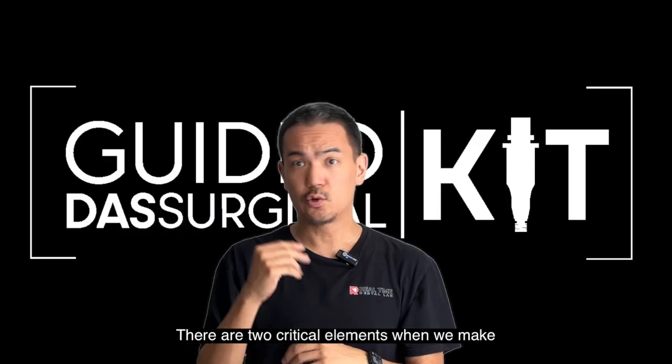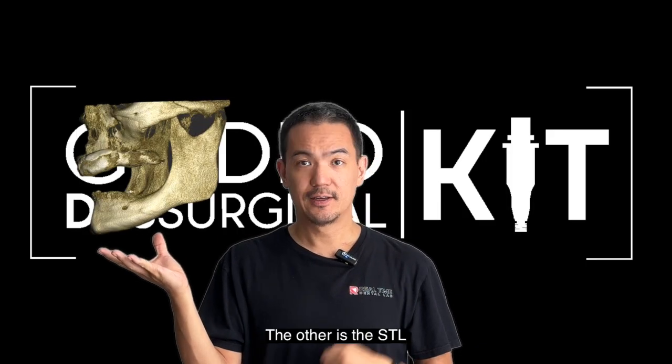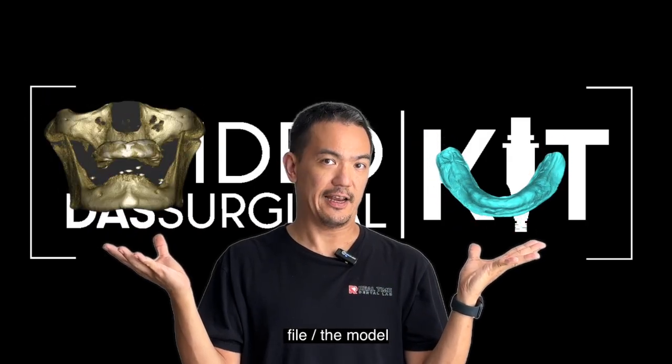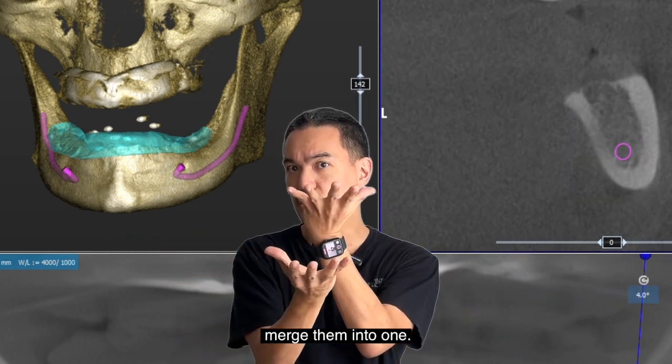There are two critical elements when we make a surgical guide. One is the CT scan. The other is the STL file, the model. And there's a critical step for it, which is to merge them into one.